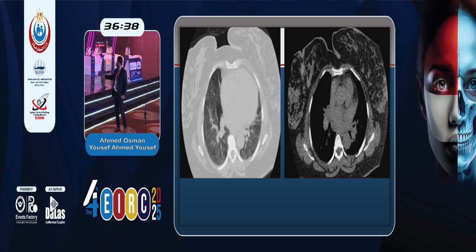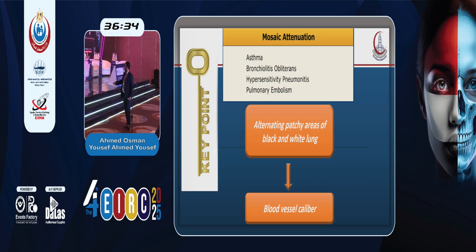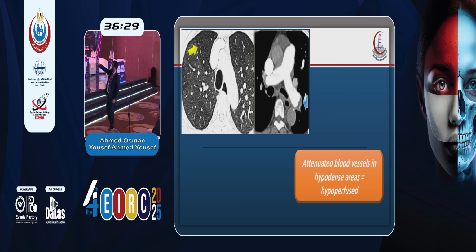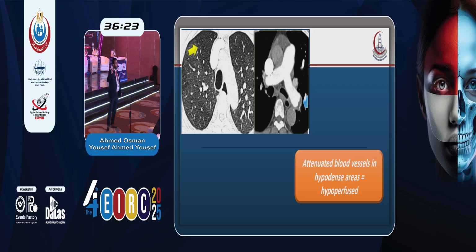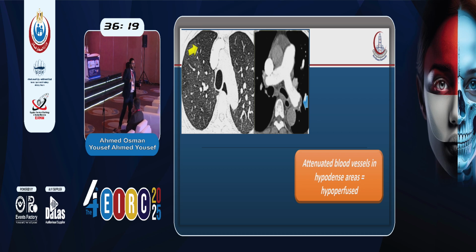If they are not equal in caliber, we are dealing with chronic pulmonary embolism or a vascular cause.